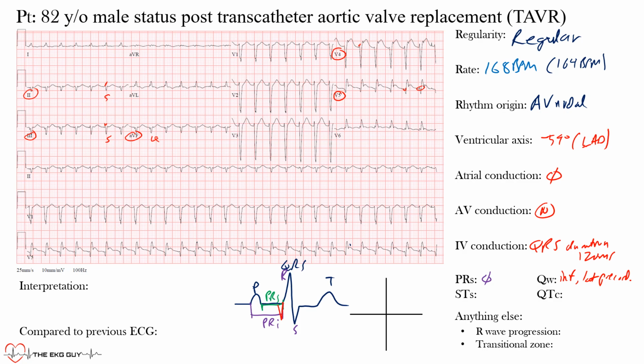What you can note here is that there is some ST elevation in lead V4. Notice there's elevation in these leads. The ST segment, which is here, is elevated. Same thing in V5. And you may even have some in V3 too, a little bit there, and maybe not so much in V1 or V2. So you do see some in maybe V3 to V5, all right, kind of that anterior portion of that left ventricle.